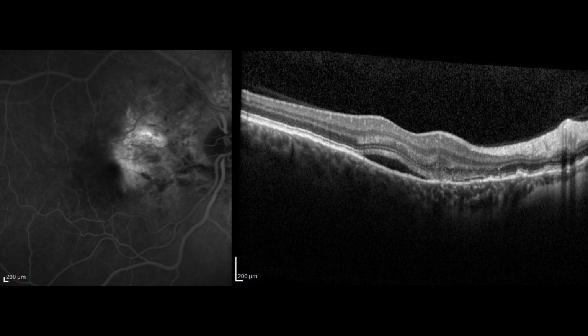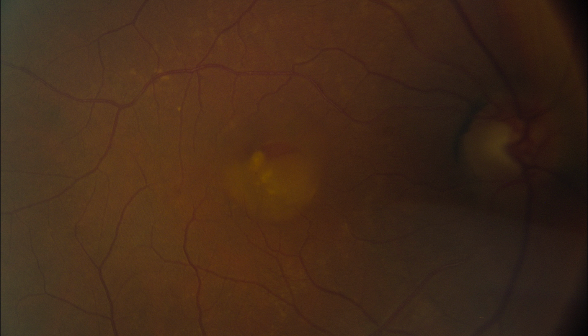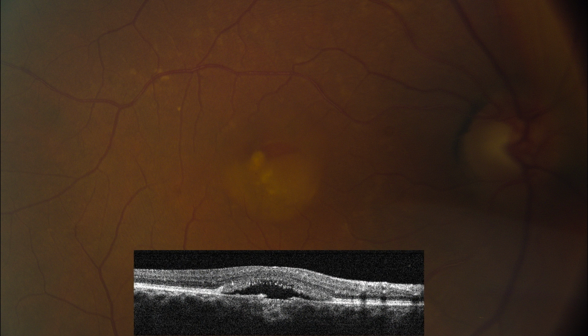This is his fluorescein angiogram that shows diffuse leakage and some hypofluorescent, well-circumscribed areas consistent with some intraretinal hemorrhage and subretinal hemorrhage. So again, you've got to do your imaging, you've got to do your due diligence in order to sort out the cause of some of these various entities leading to subretinal fluid. You can see subretinal fluid perhaps here, but also there's this sort of creamy yellowish material under the fovea. The other eye looks very similar. Here's the OCT, and this patient had Best disease.